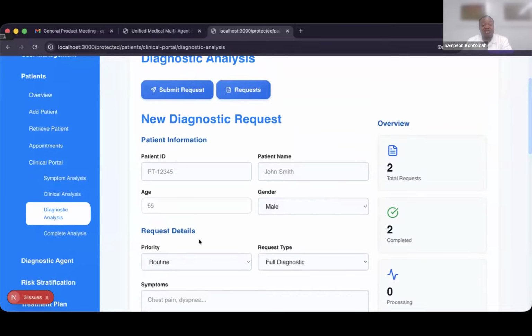All right, so this is tier 2 of the multi-agent system. If you have this subscription, which is a higher level than tier 1, the data modalities have increased from the EHR data to ECG data, lab data, and then imaging data to be able to conduct analysis of each patient. So it's one of the major tiers in this multi-agent system.